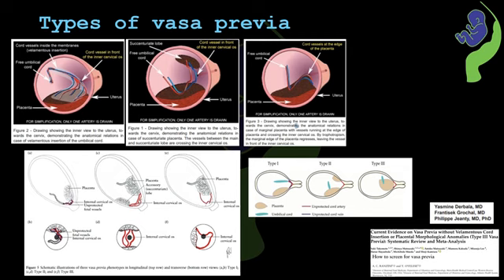Type 3 vasa previa is the least common one, in which there is generally a large curved or boomerang-shaped vessel that runs along the placental edge. That is, it leaves the placenta, goes around the internal os and then returns back to the same placenta. This generally results from the focal atrophy of the placenta. The key point in type 3 is it is a single placenta, although low lying, with a normal cord insertion.